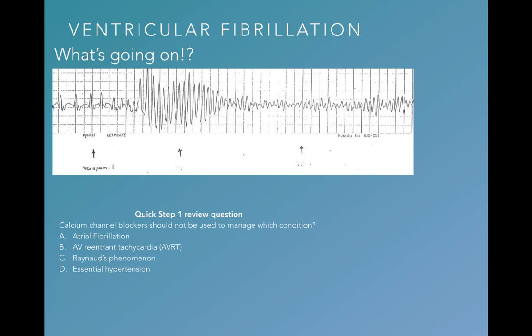What happens is this person goes into ventricular flutter, which is a fast type of VFib. And then the patient, from there, like I said, commonly VFib, the person goes into VTAC, which is, ventricular flutter is a type of VTAC. And that develops into ventricular fibrillation, as you can see by the progression of this. So what might be going on? Why would someone who has an SVT, who's given a calcium channel blocker, end up going into VFib?